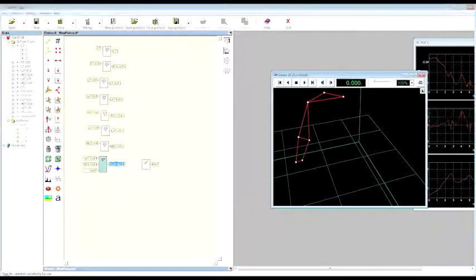Okay, and the name of the output in this case is the middle elbow point. As you can see, we can also drag and drop the results into the 3D workspace. So this is the virtual point that we have just created, and as you can see, we have in this way created a marker that belongs to the same line between the lateral and the medial marker, and that is placed exactly in the middle between the two.